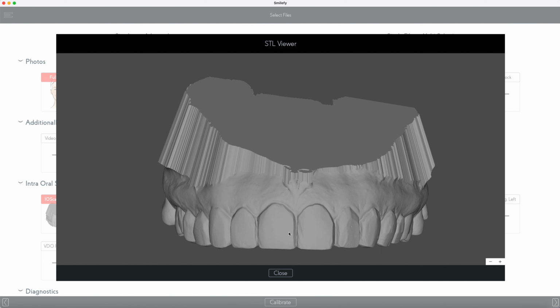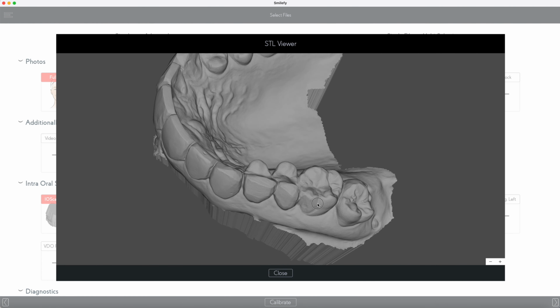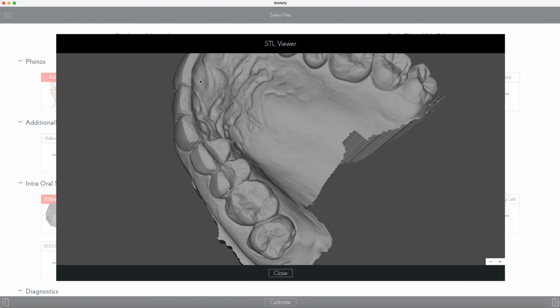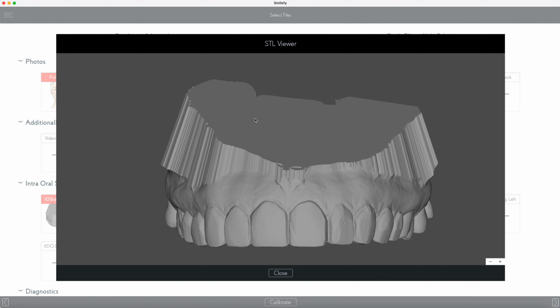We remove the composite layers, we keep the gingival margins, we redesign and we create temporaries. We will design in a way that we keep the palatal support so that we can create the silicone key, and removing the composite layers and creating the temporaries is going to take only one appointment.